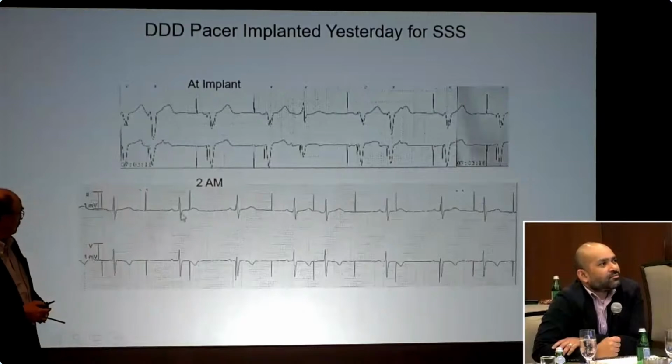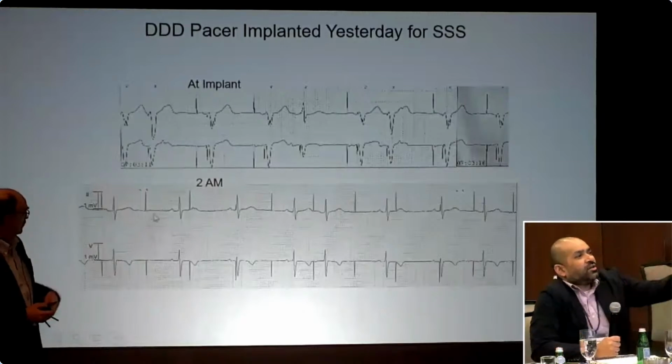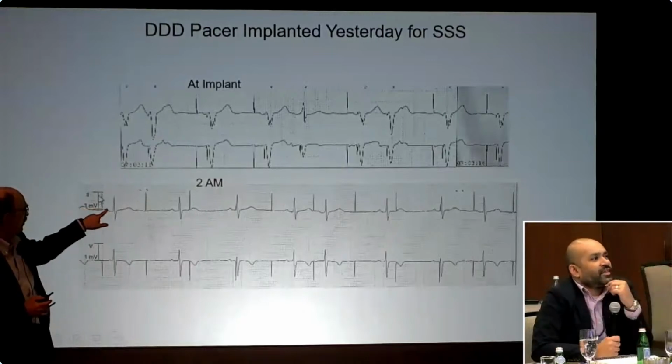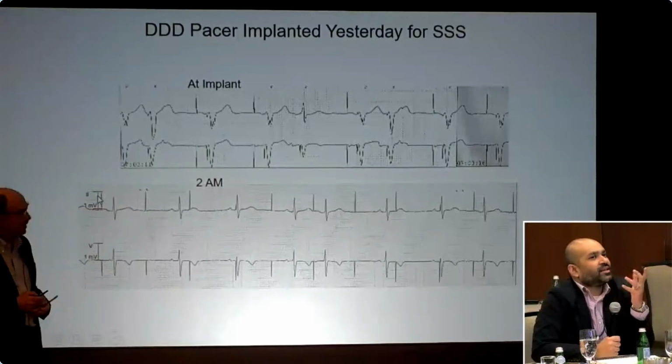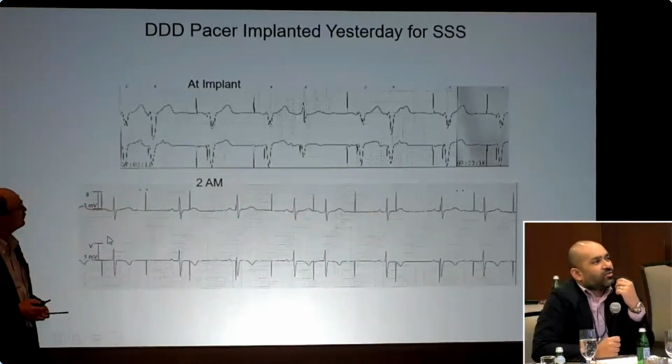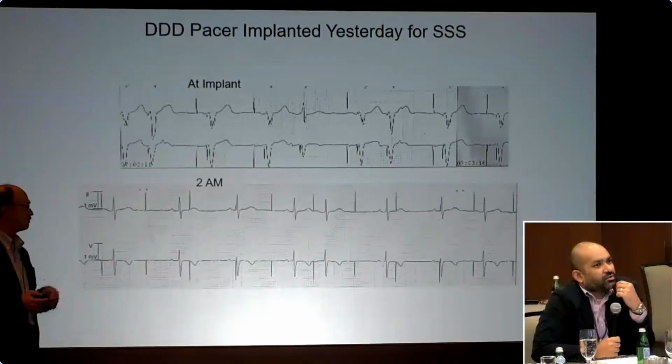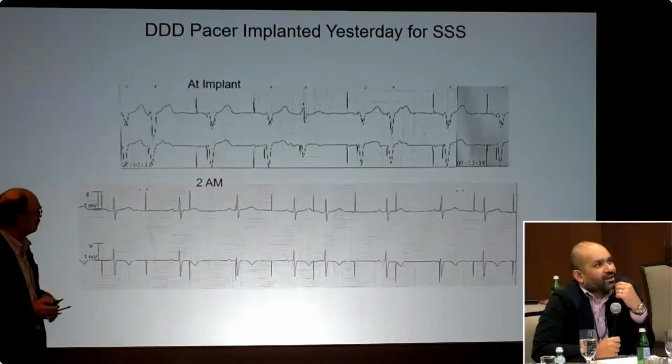Ken, I'm going to try to follow along. Which one are you talking about? This one? No, sir, just outside of the amplitude axis measurement. I don't know, it's hard to say what's going on there. I can't tell definitively. So the first beat at least comes before that. I don't definitively see atrial capture or ventricular capture after that pacing stimulus.